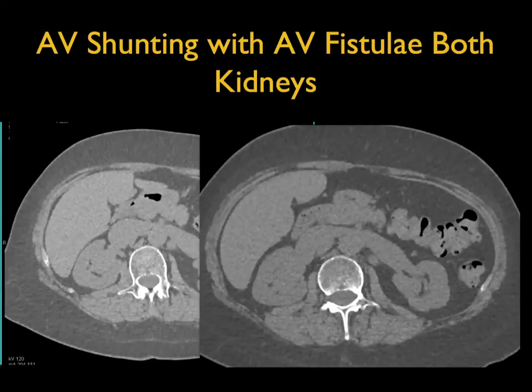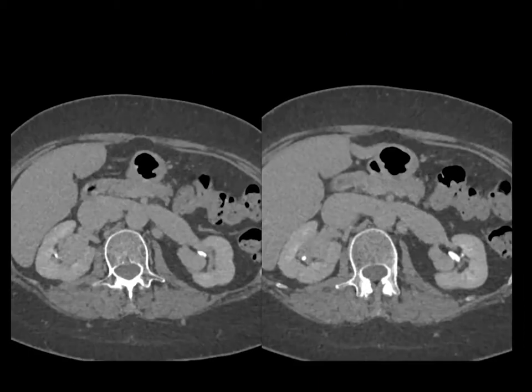Another example, look at this case. You look at this non-contrast. What's going on in the renal pelvis is they look full, and the renal veins look full. But it's hard to make much out of this. Is there something in the renal pelvis? Let me go forward and give you the excretory phase. Again, the renal veins look big, but they're not thrombosed, and there's soft tissue masses by the pelvis, but the kidney's not obstructed. Are these parapelvic cysts, but they're higher density?